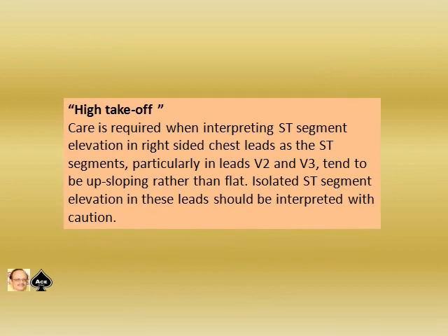Now, what is this high takeoff? Care is required when interpreting ST segment elevation in right sided chest leads, as the ST segment, particularly in leads V2 and V3, tends to be upsloping rather than flat. Isolated ST segment elevation in V2 and V3 should be interpreted with caution.